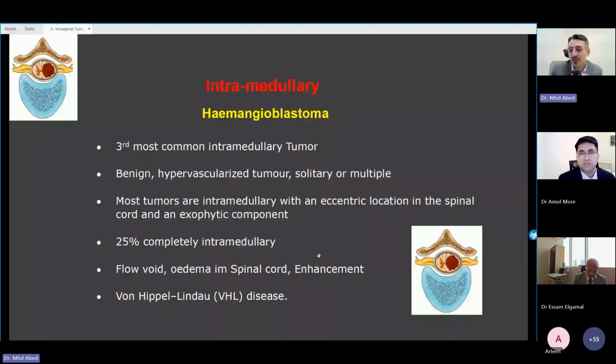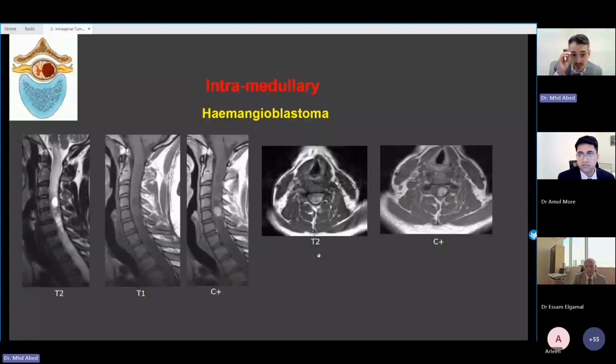And if you look at it, you will think that the tumor had nothing to do with the spinal cord itself. This is a patient who has this area of cystic lesion and some inhomogeneous lesion adjacent to it in this cervical spinal cord.